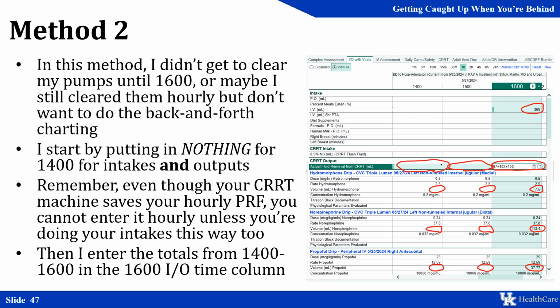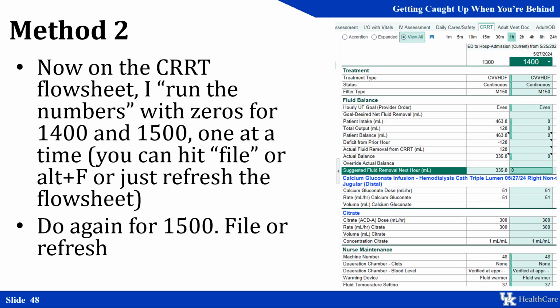It's imperative that we do the time columns for all the ones that we weren't doing the same way. If, for example, you didn't chart any intakes for 1 o'clock, but you charted the PFR for 1 o'clock, you're going to have a flow sheet that gets confused.